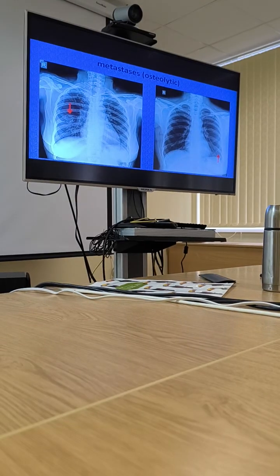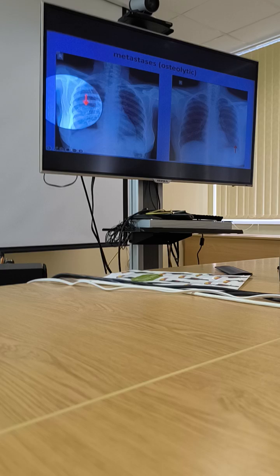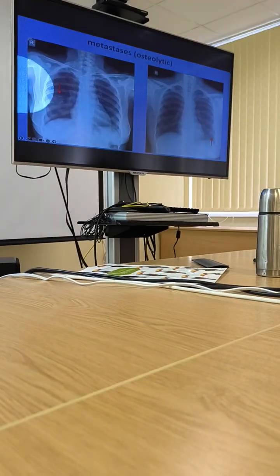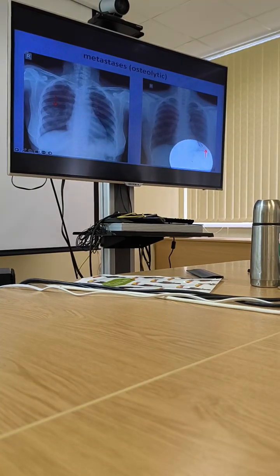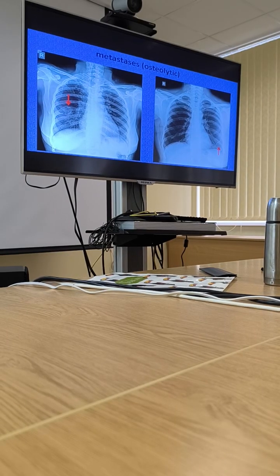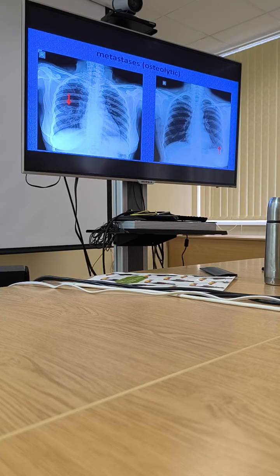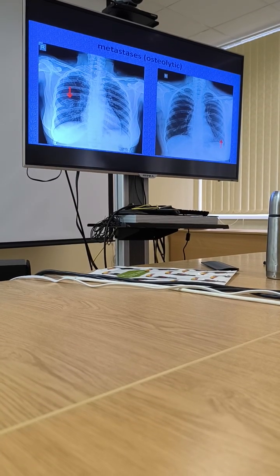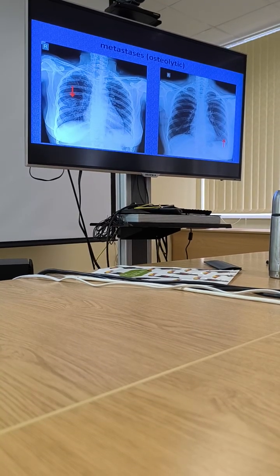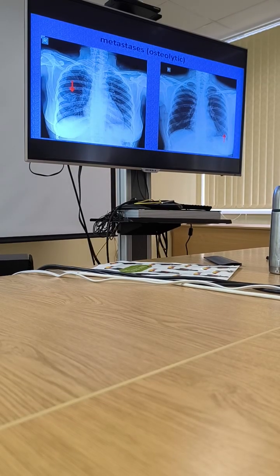Inside the bone, instead of bone, we see lucency in the bone. It could be bigger, it could be smaller, it could be of different shape, of different structure. But that is what we can see for sure, and that is very typical for cancers. By cancers, I mean epithelial tumors, like gastrointestinal tract tumors and lung tumors, which like to do this.